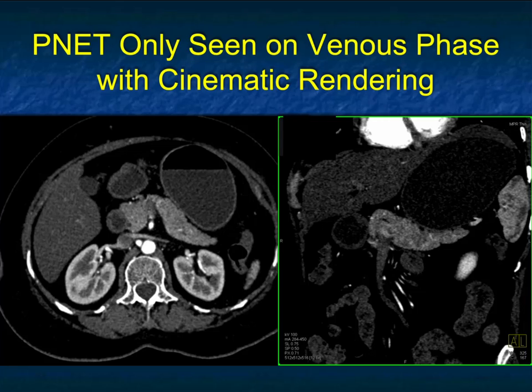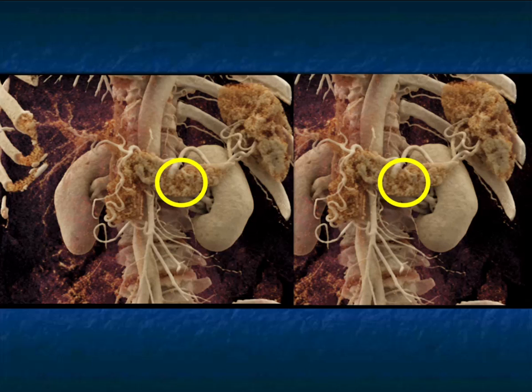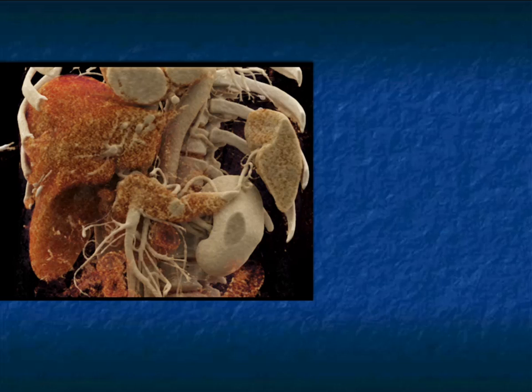Another example here, we talk about neuroendocrine being vascular and seen mainly only on arterial, though usually you see it on both phases, but best seen arterial, then it washes out. Here in arterial phase imaging, I don't see much. Do you want to argue some textural changes here? But gosh, that's kind of a little bit difficult. Maybe here, but that's not vascular. That's just maybe a suggestion of textural change, which is shown very nicely on the cinematic as well.